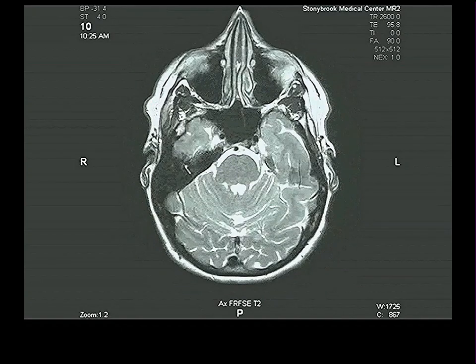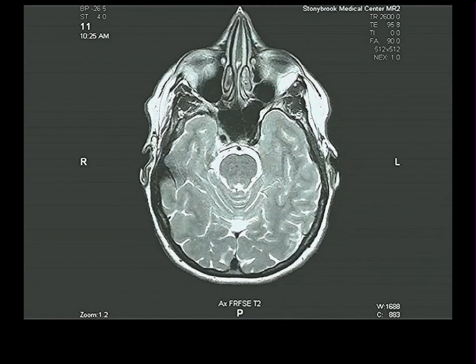Coming up again. Coming up. Up. Look at that right there and that right there. Boy, that's a tough one. I can only guess what it is. Anyone else have a guess? Oh, good guess. Nasolacrimal duct. I think that's the nasolacrimal duct. Clearly it has a little standing fluid in it on one side.